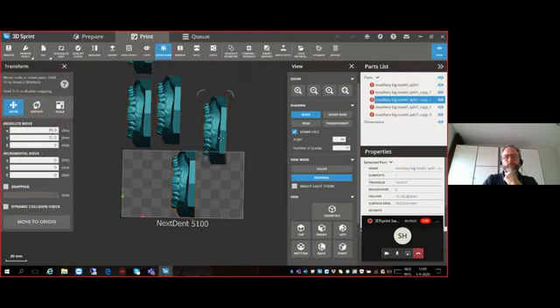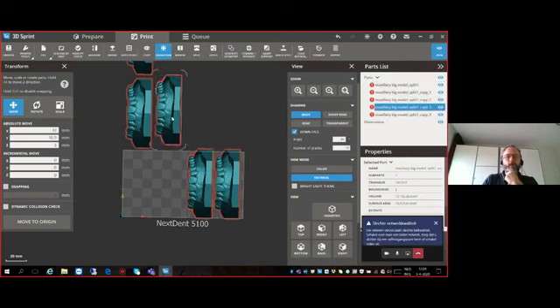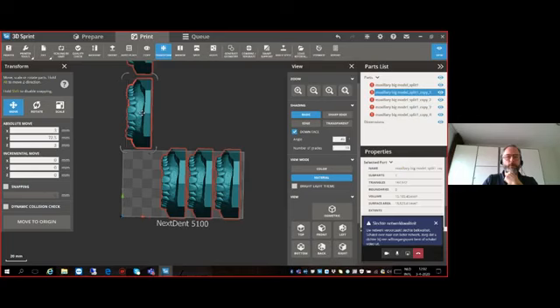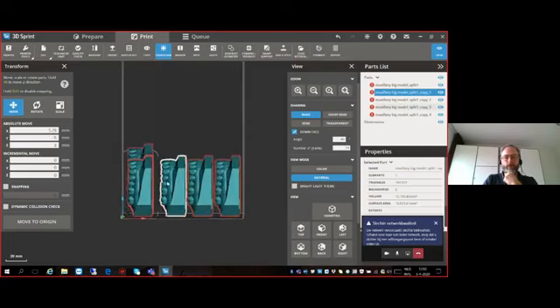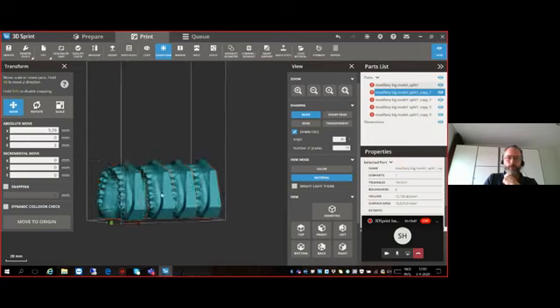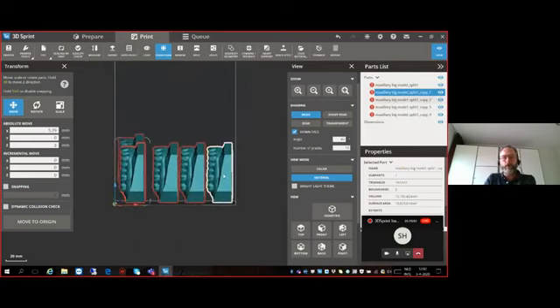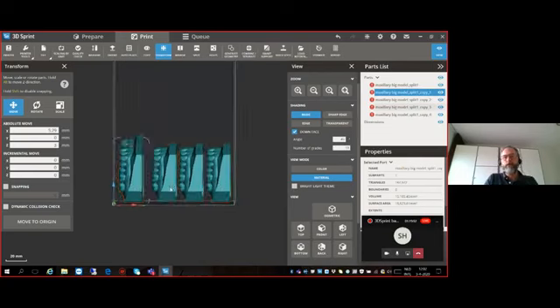Menno, maybe quickly go over this, what we currently do for orthodontic vertical printing. Yes, so normally for a horseshoe model, now we don't have the horseshoe models because this is a different file at hand, but for horseshoe models at this point, it is perfectly fine to print them in this direction. Now a horseshoe model, of course, we saw this earlier, will not have the big base and it will be without the palate, otherwise it would not be a horseshoe model. But for orthodontic horseshoe models, you can print them like this in the current software.